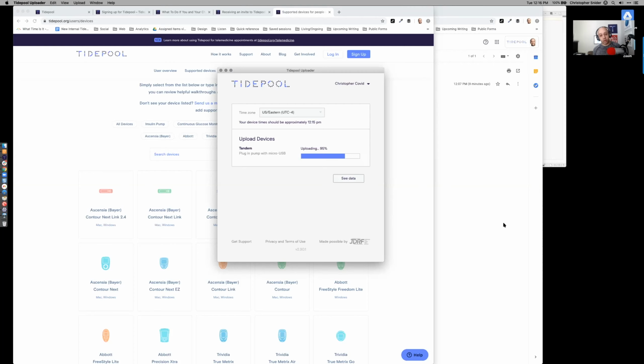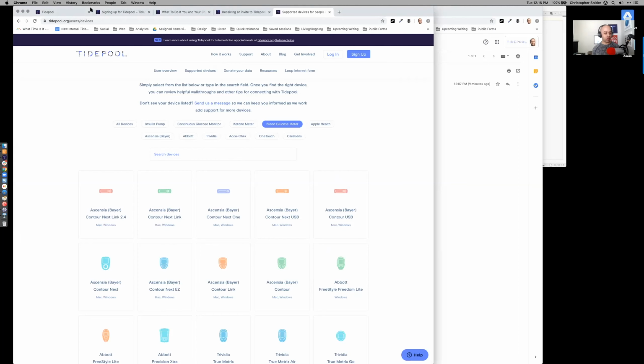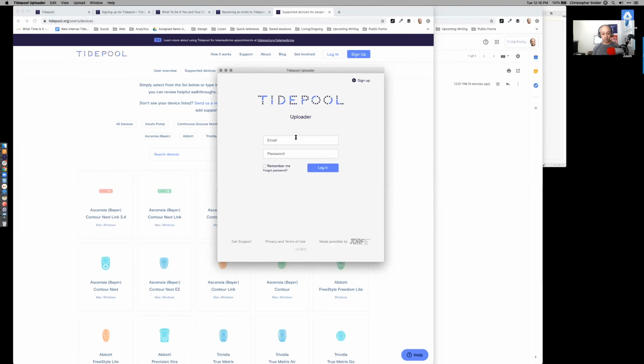This is actually a little awkward now, Paul and others, because the upload, this is actually a really fascinating thing to happen during a live webinar. It's a little awkward, but errors do happen with software. In case something goes wrong, you can click this little error button and see that something went wrong. Wow, this is a fantastic new error. I'm going to be sending an email to support@tidepool.org about this error message because I have no idea what just happened. Anyway, that's really awkward, y'all. Something always goes wrong during a live demo. That's okay. We're going to be okay.